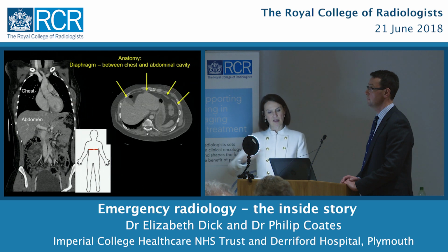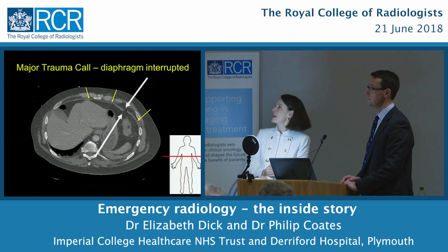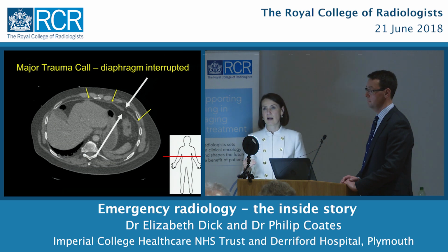And if we look now axially at the diaphragm, again, you can see that thin muscle layer between the two. Let's go back to our patient, and if you draw your eye along the line of this muscle, you'll appreciate there's a gap here. So that knife has definitely gone through the diaphragm. That is not good. He definitely will need the diaphragm to be repaired.